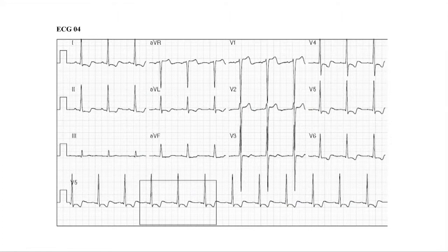Moving on to ECG number 4, David, that looks like a quite abnormal ECG. What sort of things would you expect in the patient, and when would you see changes like this? Often a patient like this one is surprisingly symptom-free. If you have something that maybe is a bit breathless with exertion, or perhaps it has a history of aortic stenosis, or somebody with a history of long-standing hypertension.